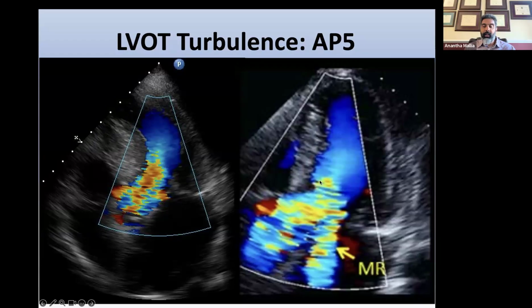Here is another interesting view where you see both the turbulent flow through the LVOT as well as the mitral regurg.